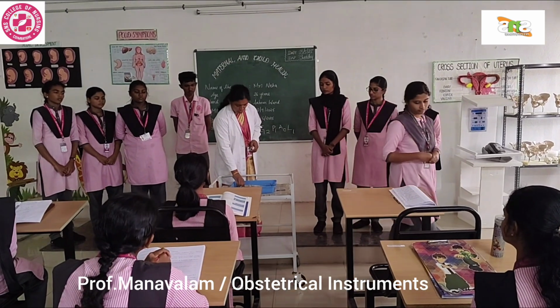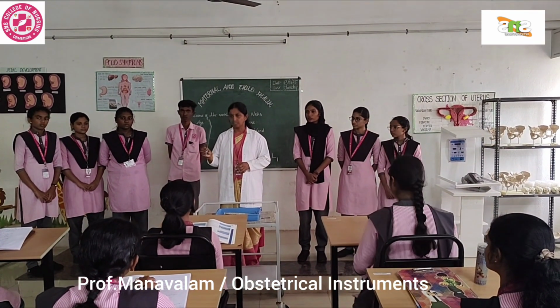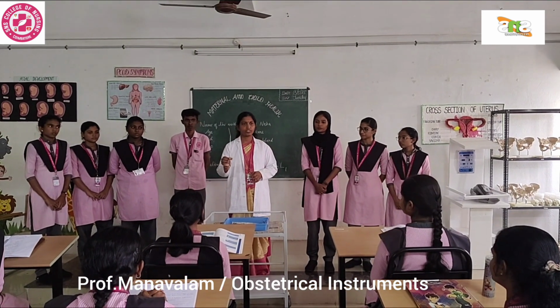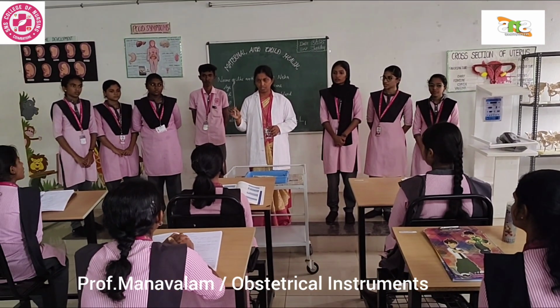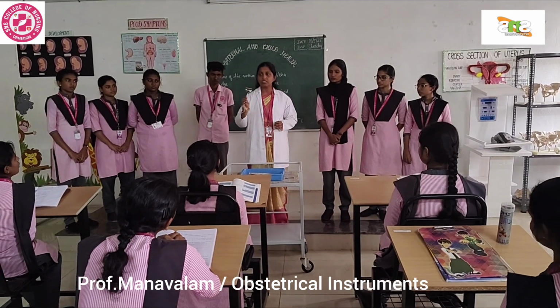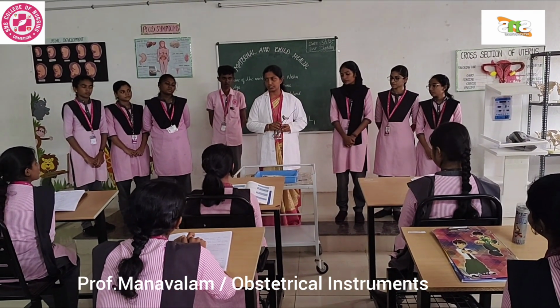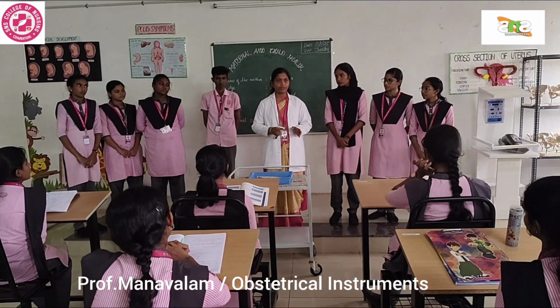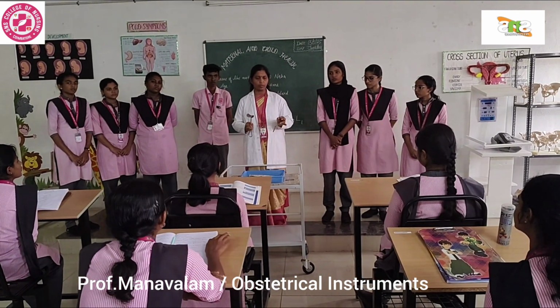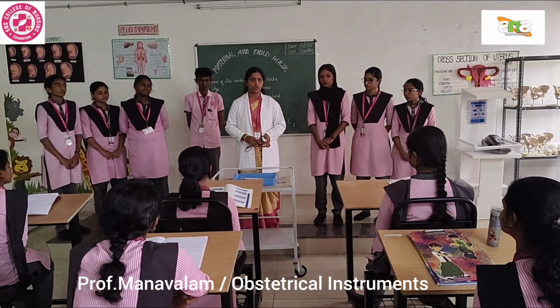Any one of you, say what is this? Uterine sound. A little bit louder. Uterine sound. So this is called a uterine sound. What is this? Retractor. So I think everyone understood about the instruments used in obstetrics. Thank you all.